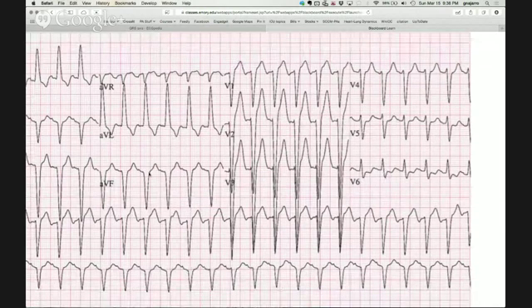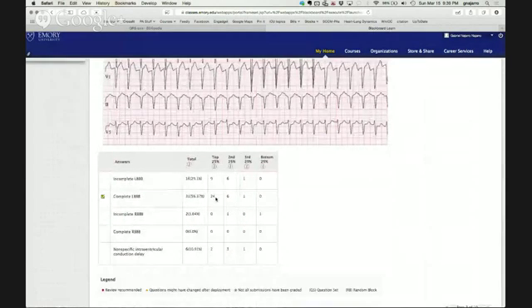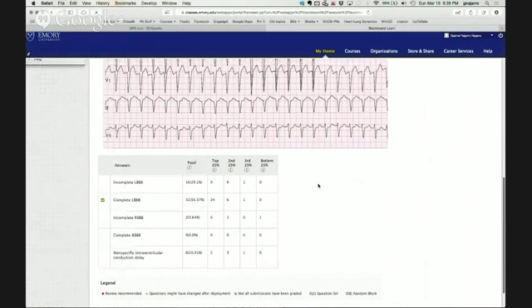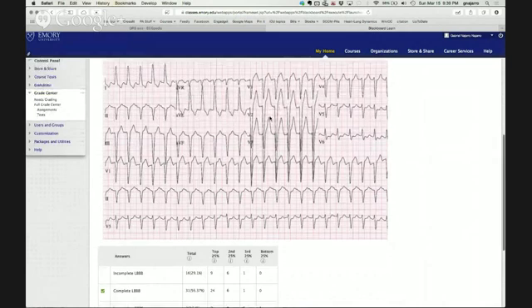Okay, and then the other thing that's helpful but not necessary for the diagnosis is there is left axis deviation, right? Up in 1, down in aVF, away from aVF. So some folks answered incomplete left bundle, but again, we know that this is greater than 0.12. Some people said incomplete right bundle, but we would have a totally different morphology here, right? We would have that RSR prime, or a terminal positive portion of the QRS in V1.